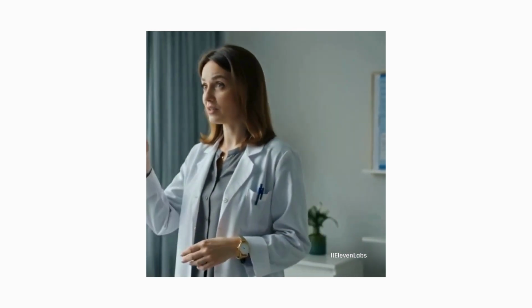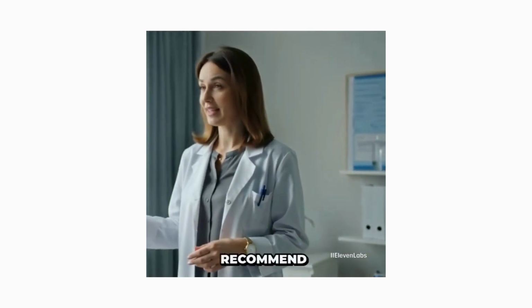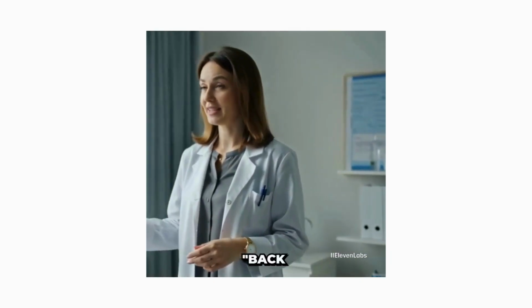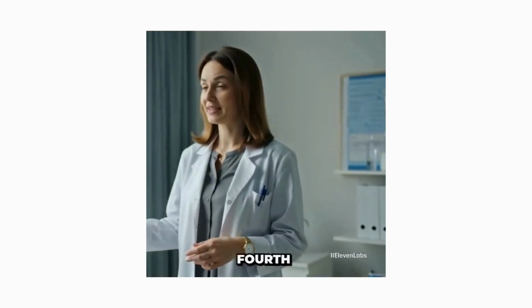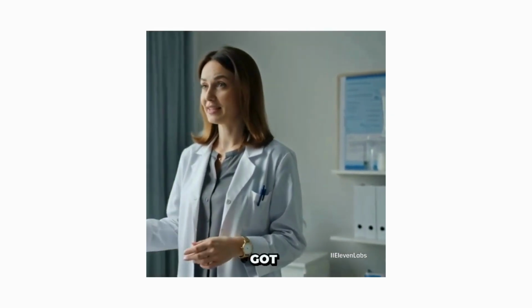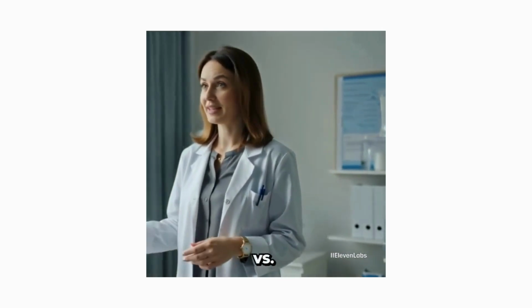The spine. Never forget, if you suspect medulloblastoma, you must recommend imaging of the entire spine to look for drop metastases. Back to our mystery case. Look at the restricted diffusion and the origin from the fourth ventricular floor. This was a classic ependymoma. If you got it right, well done. If not, remember the roof versus floor rule.